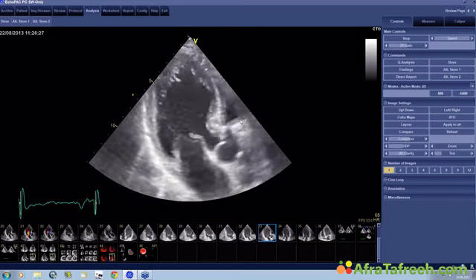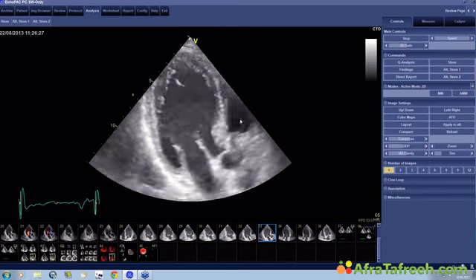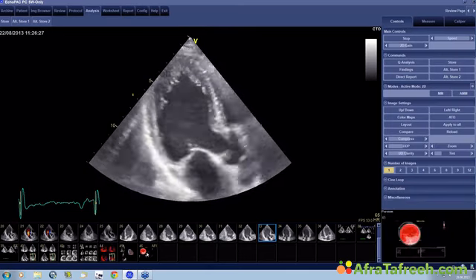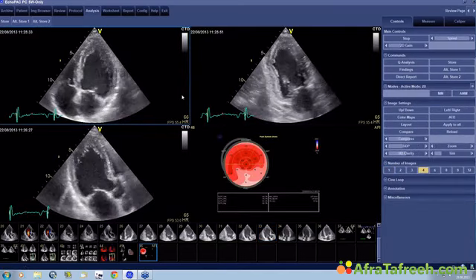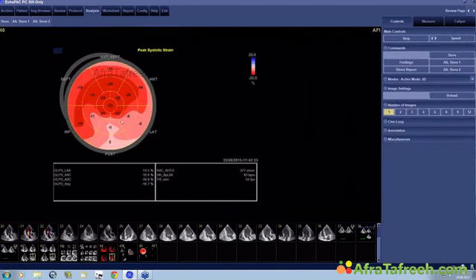Okay, now let me go to the speckle tracking of this patient. Remember, I showed you that this is something which really gives you additional information, and I think it does. This is the speckle tracking reading of this patient. Look at the image here. Again, it fits very nicely to what we see. We have the posterolateral wall, the lateral wall here affected. That's where the infarct is.